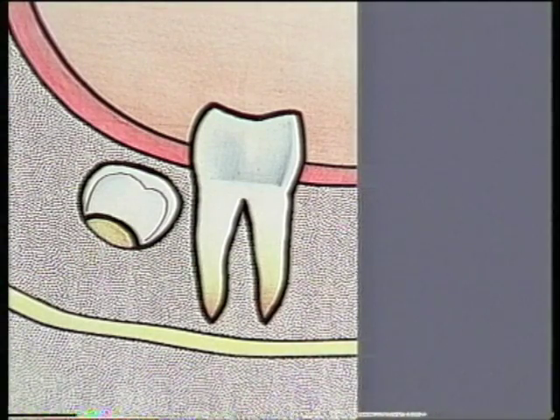In this first diagrammatic representation of a periapical film, the roots of the unerupted third molar have not yet formed, and the inferior alveolar nerve lies some distance from it. Unless you are really not thinking of what you are doing, then you're very unlikely to harm the nerve surgically.